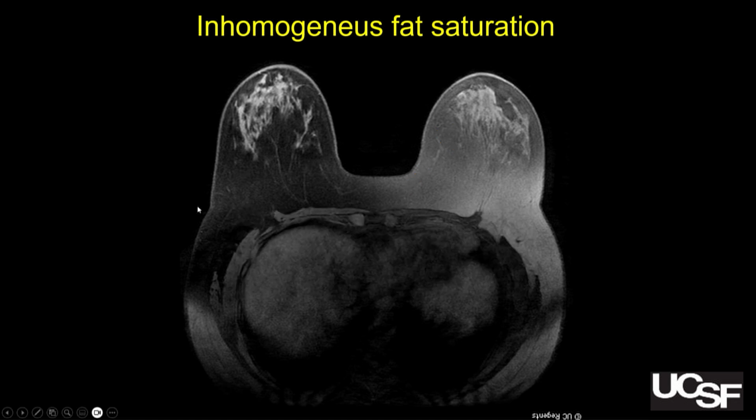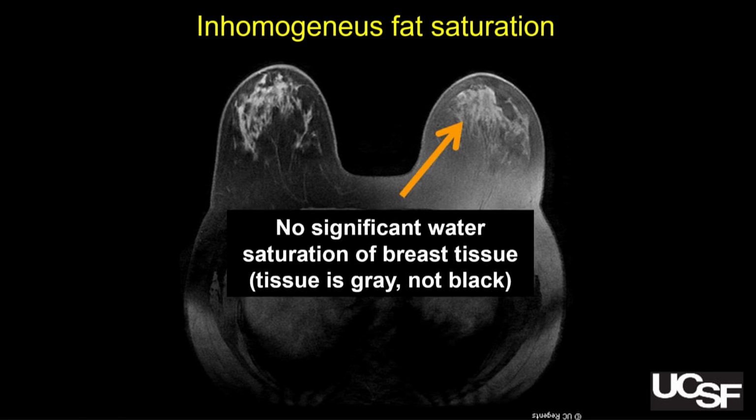The chest wall is another story, but luckily in this case, we can give that up. If it was a question of chest wall invasion, then obviously you'd have to fix it. But in this case, it looks okay. So we let this go because at this point we'd already spent or wasted 15 minutes troubleshooting, and you want to get to the contrast so that the patient can have a diagnostic exam.